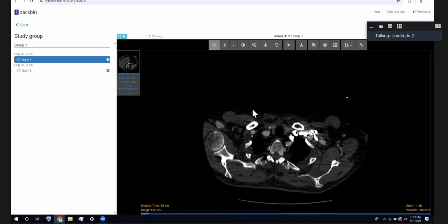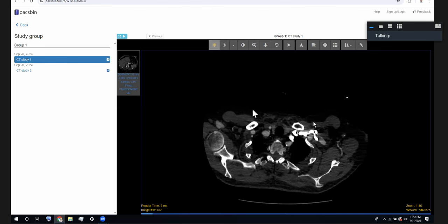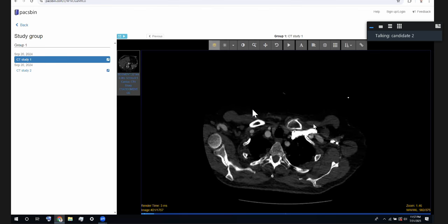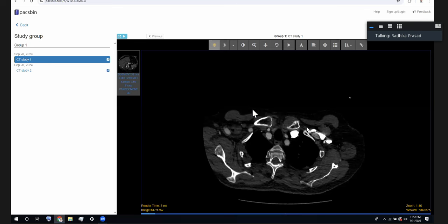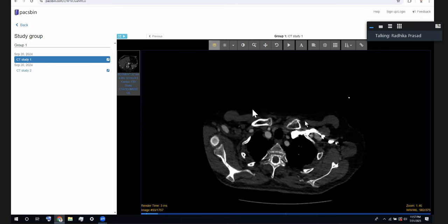Okay. So provided are the arterial phase images. It's still loading. Don't worry. Whilst it loads, let's talk about technique here. You've seen the right thing. You've got the diagnosis there. You've seen the area of abnormality. But remember in the exam that you have to really exaggerate the urgency of a finding.